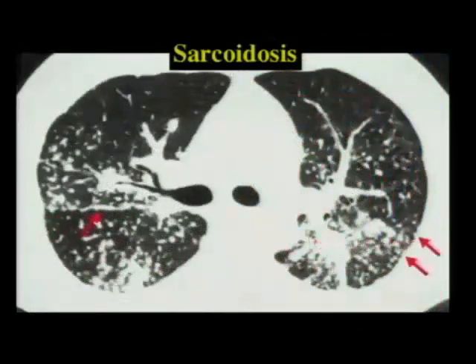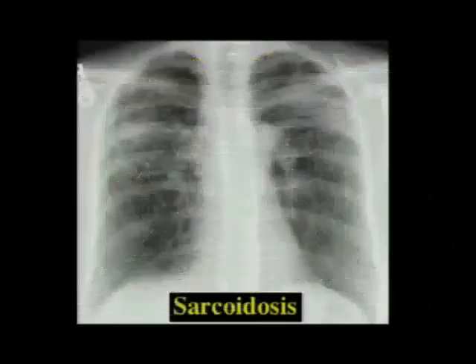Nodules are visible at the pleural surface along the fissure and at the pleural surfaces peripherally. We also see nodules clustering in relation to central bronchi and vessels, a very, very typical appearance, virtually diagnostic of sarcoidosis, and this is a very nice example of a perilymphatic pattern.